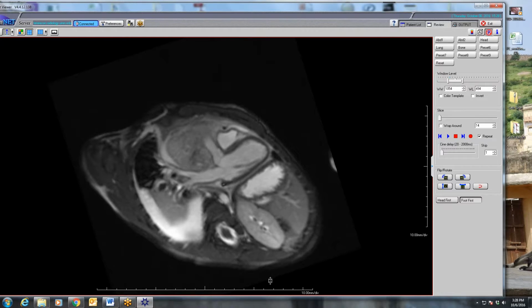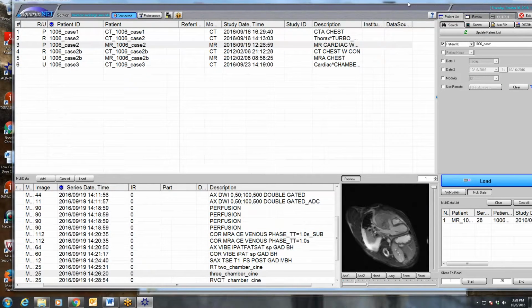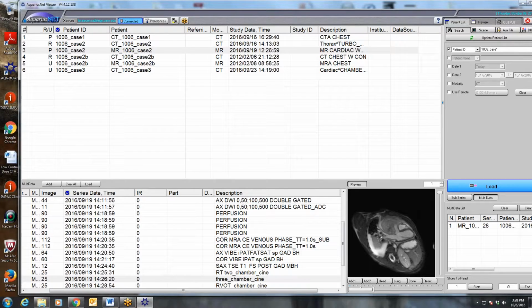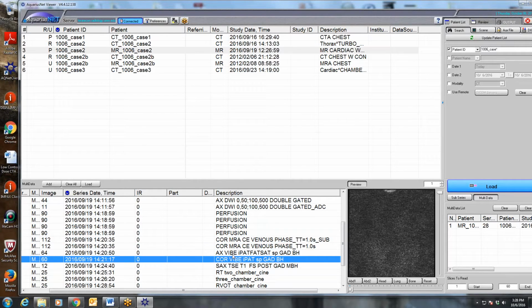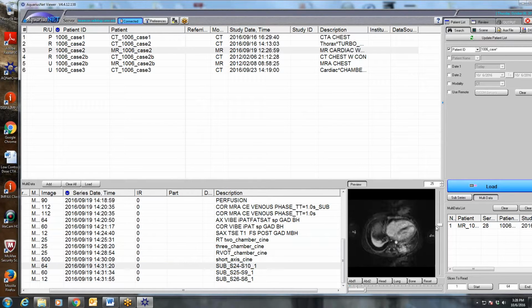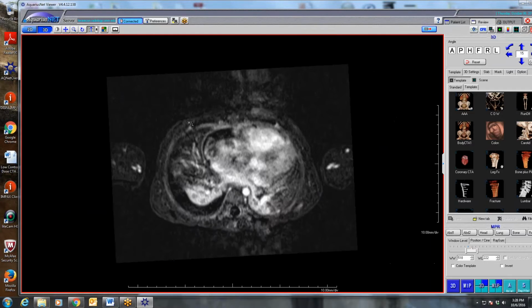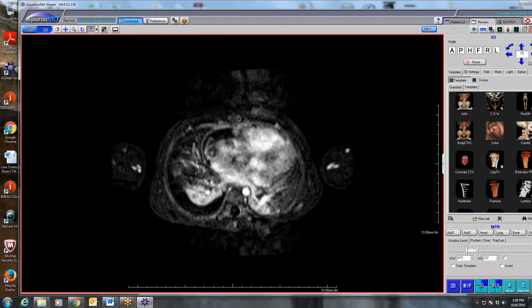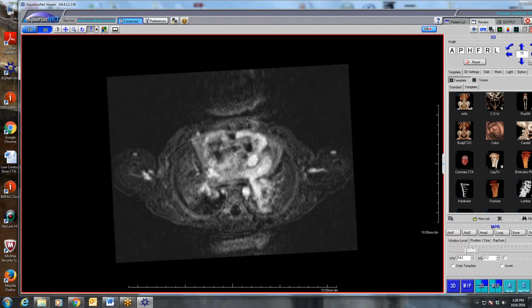This is the current MRI, but this thing was cystic. It had some areas of necrosis. It was extensively enhancing, and we thought it was going to be another mediastinal germ cell tumor. And sure enough, they biopsied it recently, and this was another mediastinal germ cell tumor. The path on it currently is a yolk sac tumor, which was exactly the same path as the other case that I showed that was from 4 or 5 years ago.